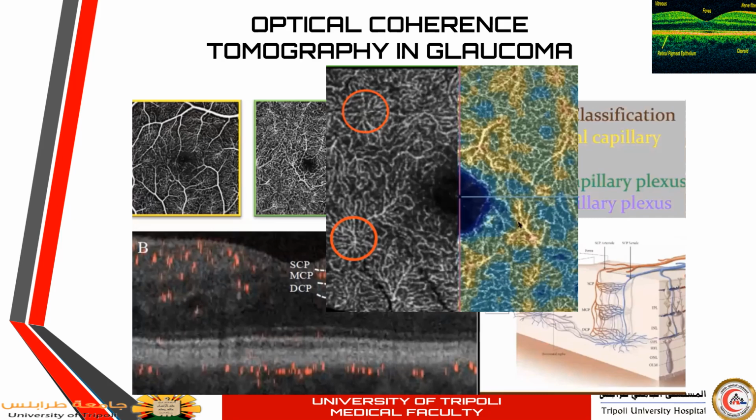As you can see here, small blood vessels run vertically, and then a fan-like arborizing structure is seen, converging toward the foveal avascular zone. This is the density map, and it is exactly the same thing. The areas in yellow are where there is blood flow. In the dark areas, there is no flow. So this is the deep vascular plexus.